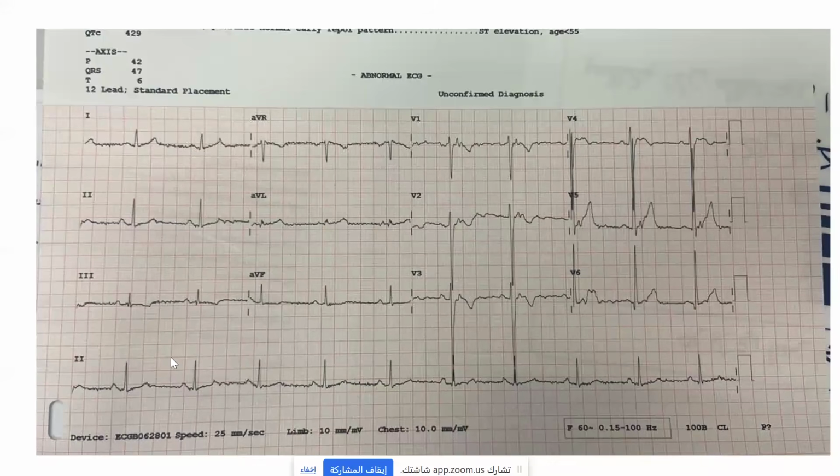Okay. I will stop at this ECG, and after that we can arrange another session if you want. But if we arrange another session, I need the attendees to contribute more. I have more than 1,000 ECGs, all real, and very nice ECGs. We should contribute more and more. But let us finish with this one. Can anyone comment on this ECG?